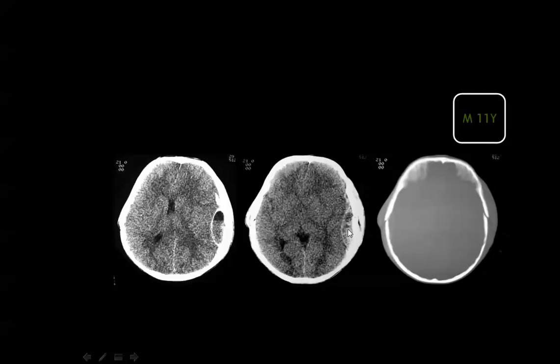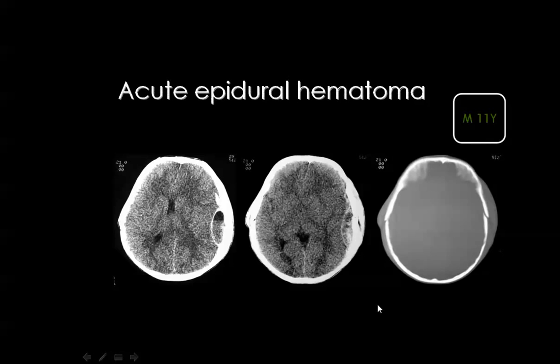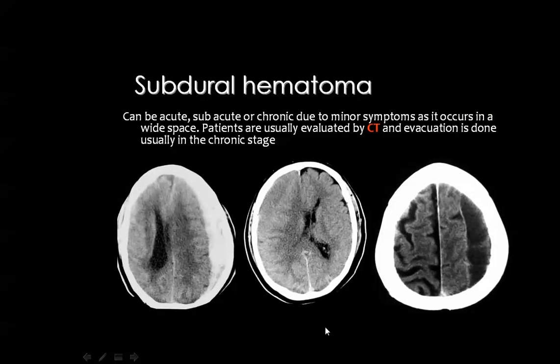Then if you see a hematoma like this, you can expect that this is a relatively subacute or chronic hematoma. But considering the recent history of trauma, the presence of fractures, and the presence of subgaleal blood, this is an acute hemorrhage, but the acute hematoma here is not that bright because the patient is anemic.